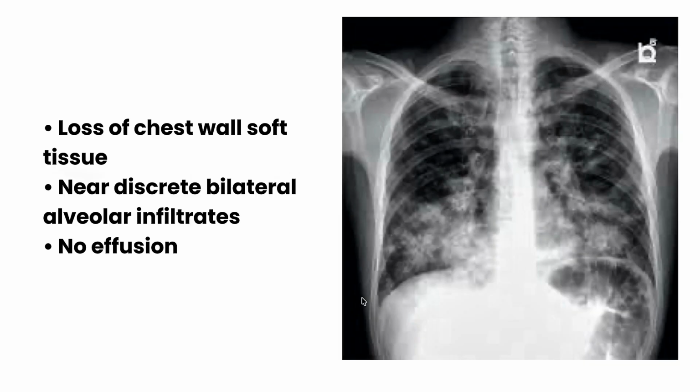Our third case is again a fairly well taken radiograph, but again, one notices the slight rotation, according to the increased medial aspect of the clavicle in relationship with the spinous process. But here, one quickly wants to look at this radiograph and say, I think this is this.